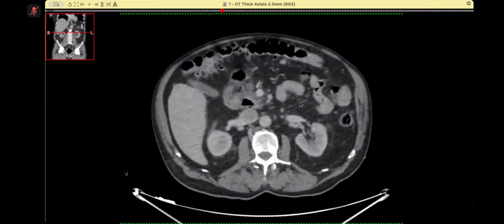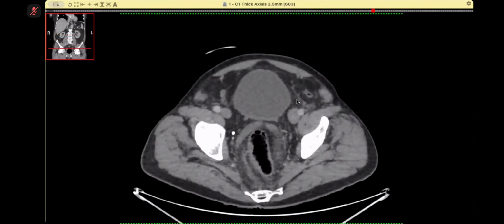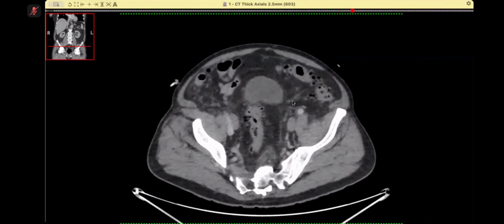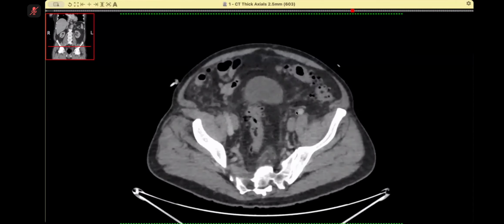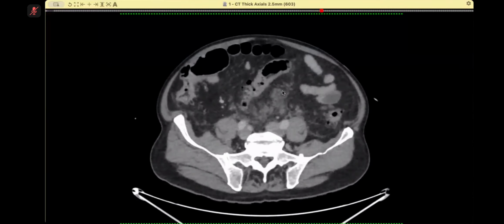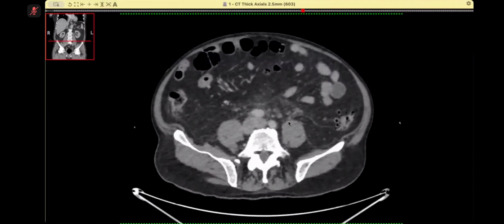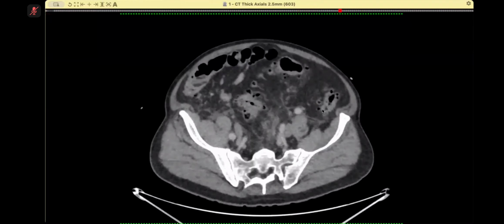And also, there is a concept of thrombophlebitis. Usually, when there is acute thrombosis in any part of the body, maybe head and neck or the lower limb or whatever, there can be surrounding inflammation. And this is that zone. Acute, then gradually this edema subsides. But the key finding even here is, look at this. This is away from the colon. And that was a key finding to pick it up. So these kinds of cases can come also as a long case.